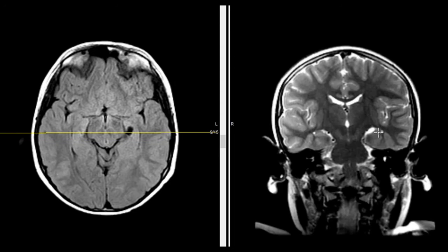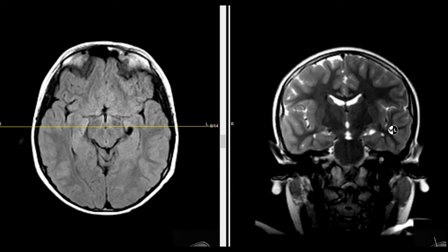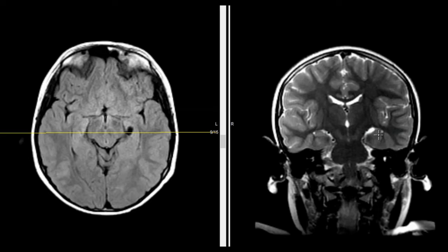The hippocampal formation itself is normal in signal, but it looks like it's just getting compressed or has a little bit of mass effect by this little fluid collection. And this is a choroid fissure cyst, which is just a benign cyst. In a choroid fissure cyst, sometimes they're asymptomatic, or oftentimes asymptomatic.